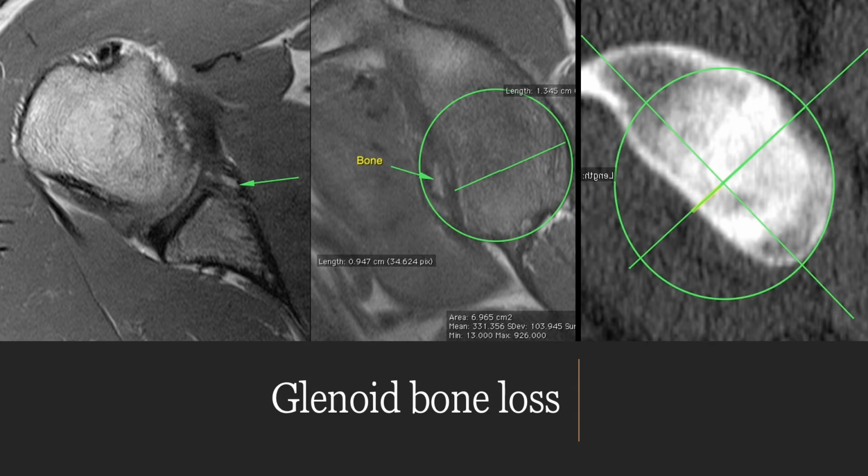So they started using various techniques to measure what the estimated glenoid bone loss was, and the simplest way is something called a best fit circle. In this, what they do is they draw a circle that fits best the inferior quadrant, posterior inferior quadrant of the glenoid, and complete that circle to give you a sense of what the total glenoid would look like.